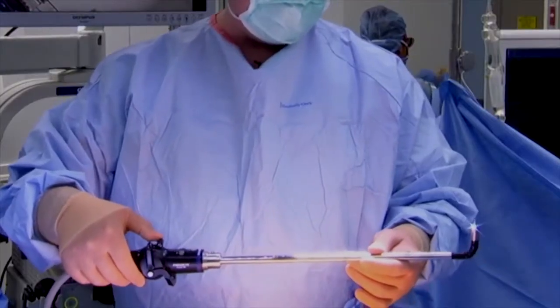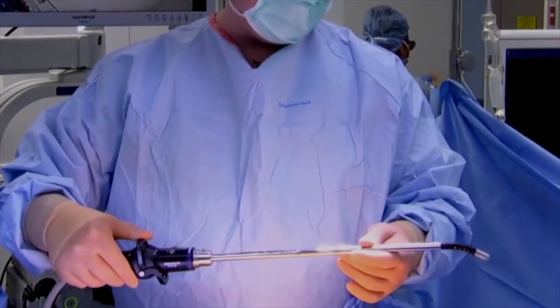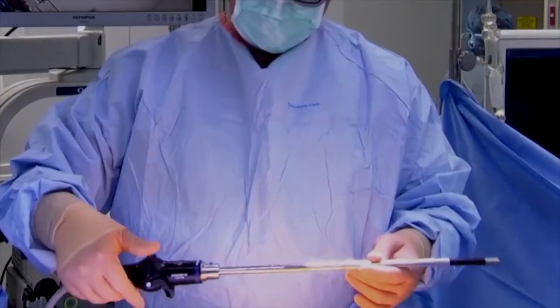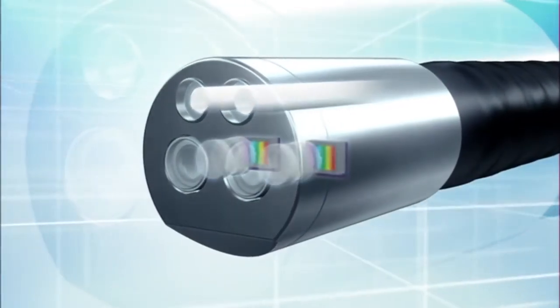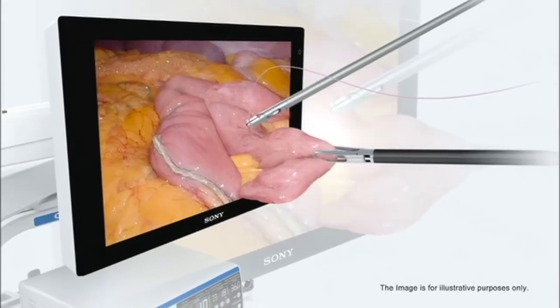Or we could even combine design features of a rod lens system with those of a flexible system. We could put chips in the tip with a bending section and allow all kinds of angles to be selected. For example, this dual lens 3D endo-eye video scope, which transmits a 3D operating image for clinicians to get greater depth perception. Videoscopes are the latest in medical imaging technology, and as this technology grows, the quality and clarity of minimally invasive imaging is improving all the time.